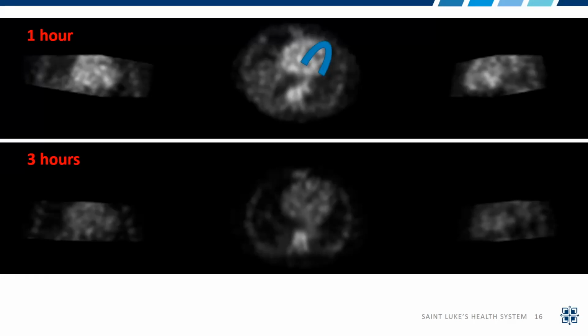But the other problem that you run into is that your eyes kind of play tricks on you, because if you actually look at the count profile of your blood pool or your myocardium between 1 hour and 3 hours, they're actually relatively constant, given the imaging time. But what you have in the 3 hour, and you can kind of see it in the spine, is that you have an increased uptake in the spine and the rib activity. And when you're doing these SPECT images and looking at the myocardium, it's normalizing itself to the relative intensity of the hottest pixel.